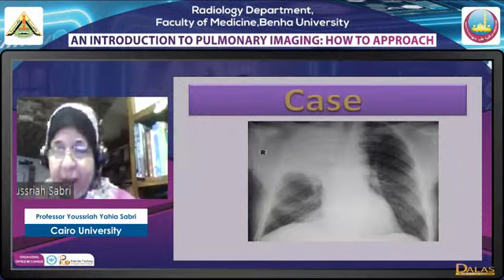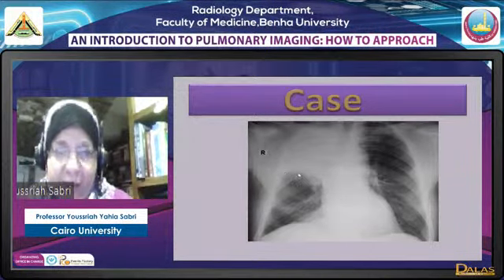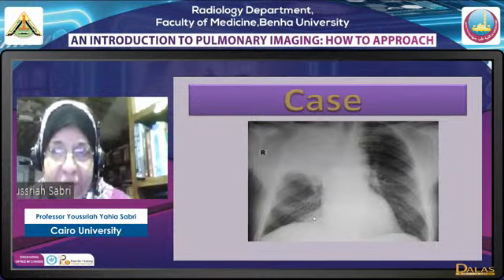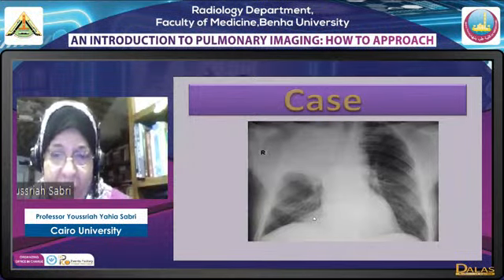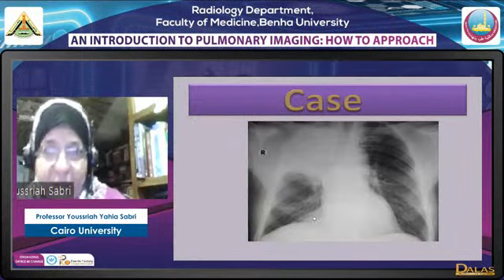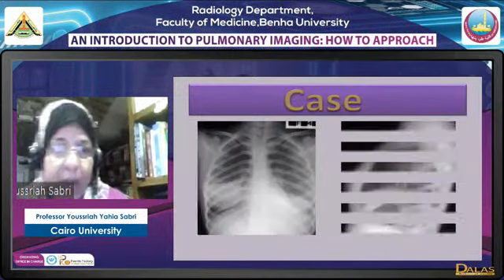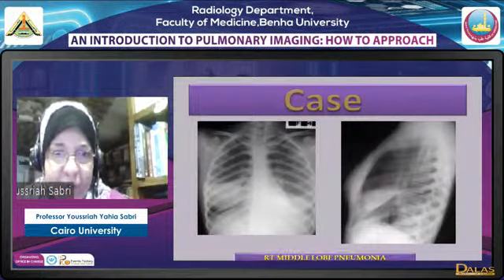This is an upper lobe opacity. But now we have the minor fissure here appearing as a straight line. We have a linear, lower well definition of the lesion. This means that there is no shift of the fissure, meaning that actually there is no volume loss. This is a consolidation of the upper lobe. Again, a lobar consolidation is most likely pneumonia. This is a middle lobe consolidation, middle lobe pneumonia, and we have described it before.